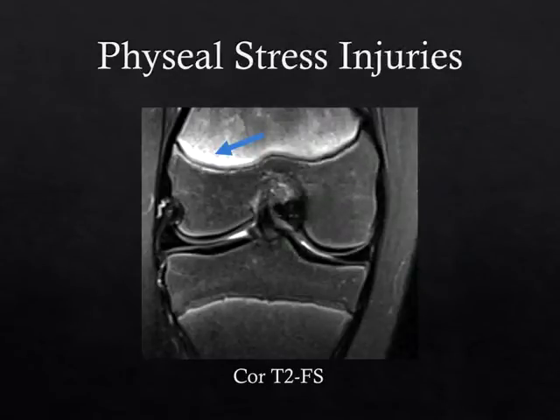The edema is pretty much always on the metaphyseal side of the physis, and there's some thought that these chronic microfractures occurring at the physis and leading to inflammation and potentially even small areas of ischemia are essentially interrupting normal ossification in that location, and so you get persistent cartilage and chondrocytes basically leaking into the primary spongiosa of the bone, accounting for this increased T2 signal.